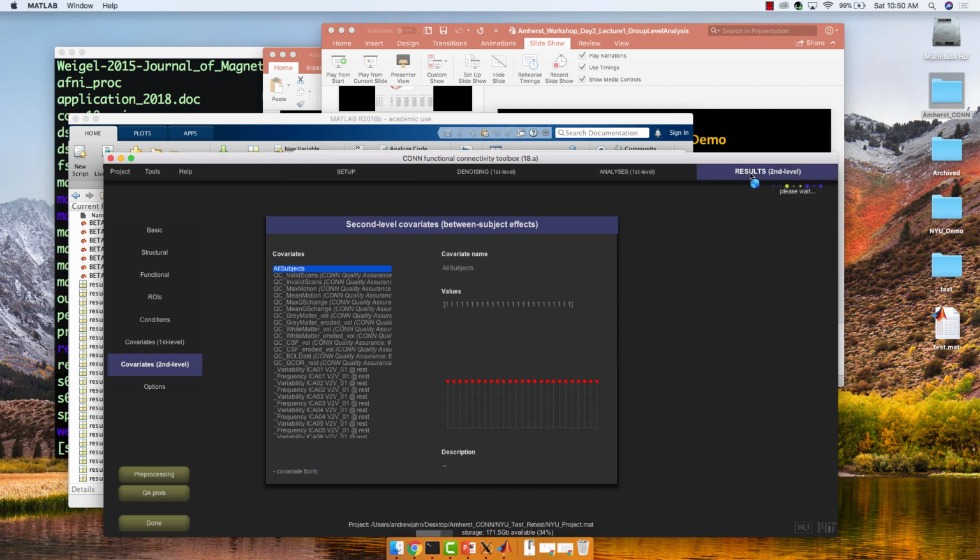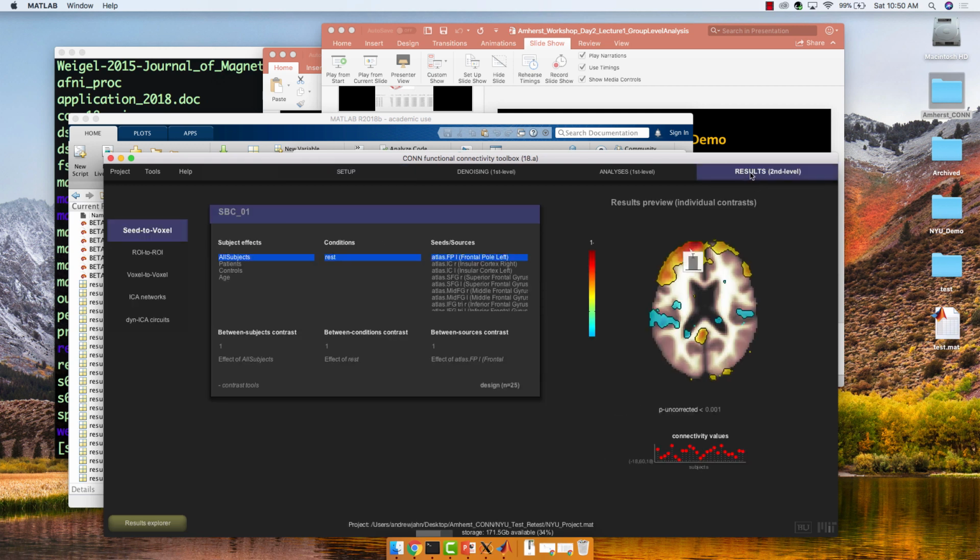In any case, once you have that, so I just defined a regressor here, and then I have it right here, right? Okay, those are just random values. It's not going to mean anything. I only gave it 5 meaningful values, so it's throwing a complaint here. But if I fill out the entire vector with the values that I actually collected, that would then show you where they're accounting for variance in any of those voxels.